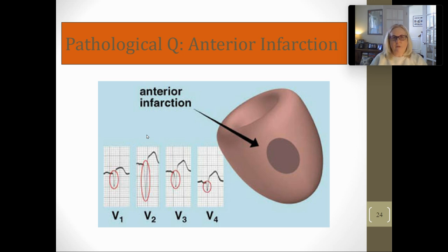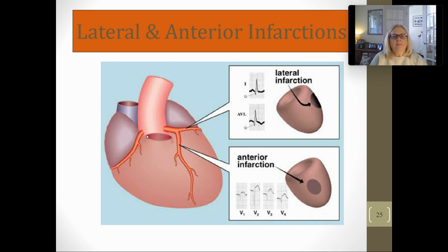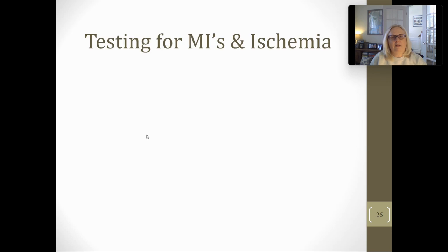And then our apical, of course, are 5 and 6. I guess I don't have that on here. No, I don't. Okay. So apical infarctions for number 20 are in leads V5 and V6, making sense because V5 and V6 are actually placed in our apex in our armpit, right? Yeah. And again, it's only 2 leads that represent the apical region, so they both have to have a change.